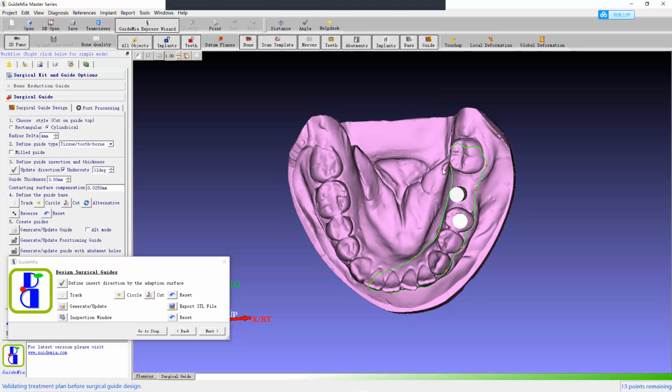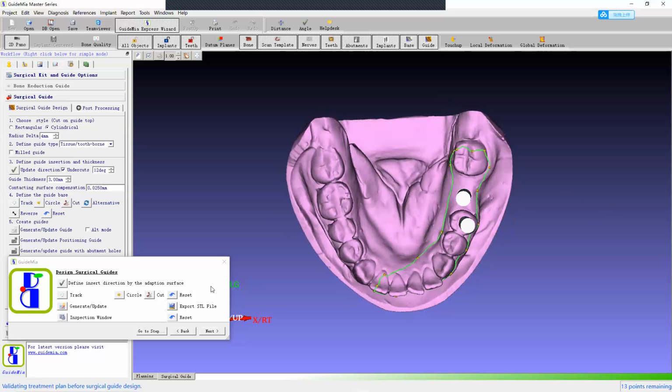Gotcha. Okay, now we finish the profile, and we click. So as I said, 3 things: direction, profile, and we cut this area. If you look here, we have multiple options. We can check the boundary as I just did, or I can do this circle thing. What this does is use the screen to define a profile like a cookie cutter, so you can cut. So if I don't like this area, I have to reset. Now let me show you this. So I have to circle.